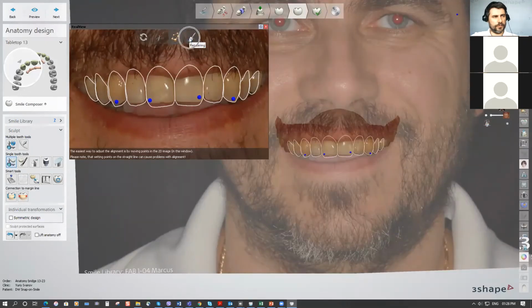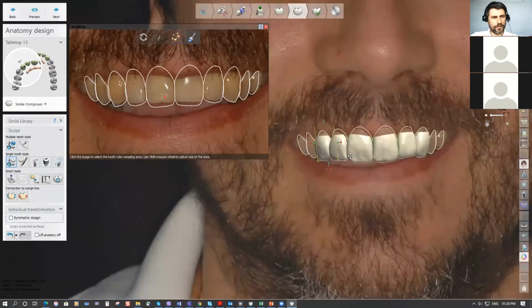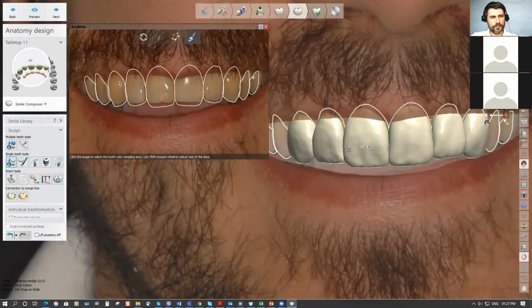Of this workflow, I have the rendering step. I need to click on the rendering step to apply my design, 3D design, and I still have the sculpt toolkit to transform my teeth, one by one with the tools here.